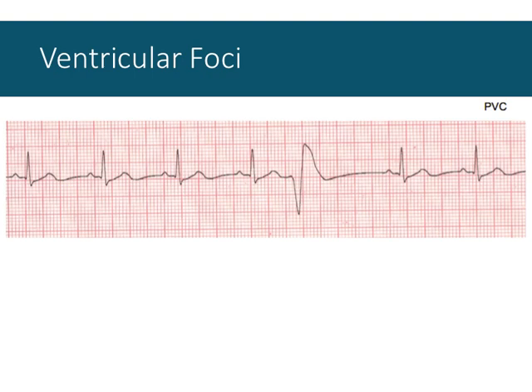And the classic example is the premature ventricular contraction, which is often experienced by some elite athletes or some individuals as they fall asleep, when the rhythm of the heart naturally slows down and the signal from the SA node is too slow, so the ventricles themselves depolarize. Nothing really happens. There's nothing bad about this. This simply resets the normal electrical rhythm of the heart. And except for this one instance where we observe a PVC, we have normal sinus rhythm.